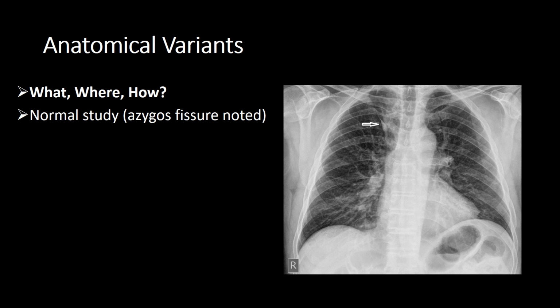What, where, how? Normal study, azygos fissure noted.